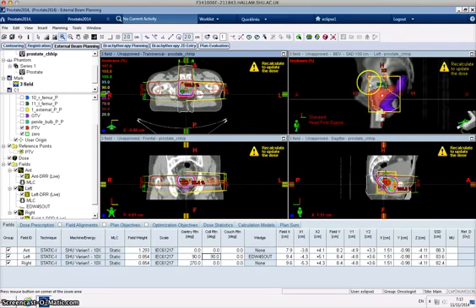The problem we've got now, though, is because we've rotated the collimators round, it's kept the same field size, so our field size is now wrong. Okay, so if you were to do this in clinical practice for a living, then you would know to set your collimators to 90 or 270 for a lateral at the beginning. We've not done that because I want to show you the process by which we need to do that.